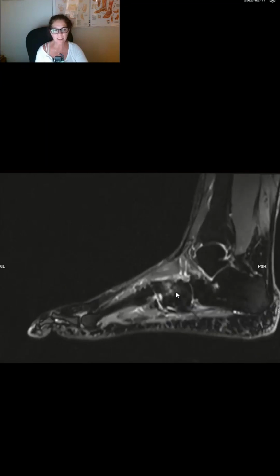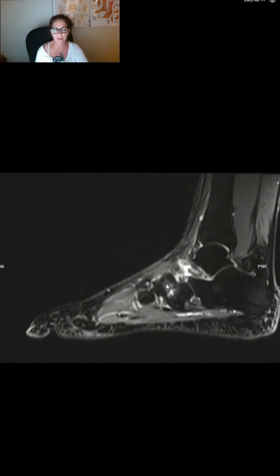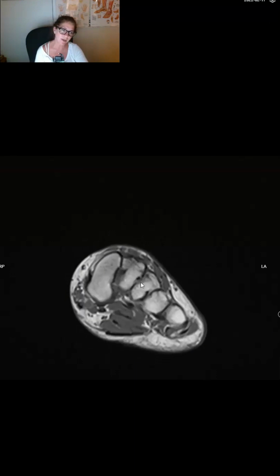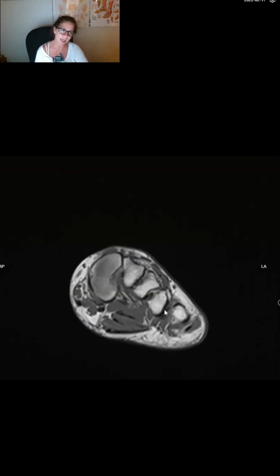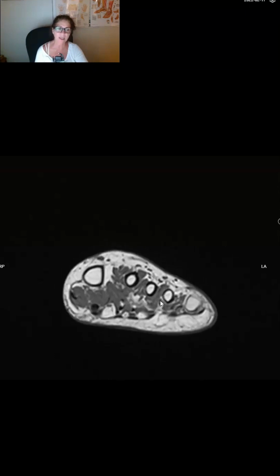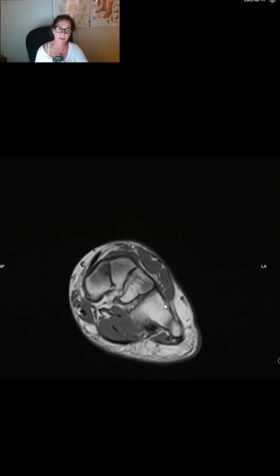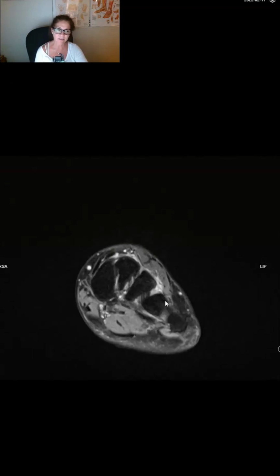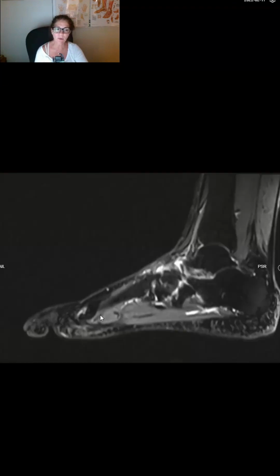So what I'm seeing here is between the cuboid and the lateral cuneiform, there is that stress-related edema. And I would say that looking at the Roman arch of the midfoot, we can appreciate that there is some kind of osteophytes and degenerative change, and there's a subtle gapping in between the base of the fourth and fifth. So as the fifth goes out, which is making a bunionette deformity, we can appreciate that there is some kind of mismatch between the cuboid and the lateral cuneiform, and indeed there are interligament sprains in this region. We talked a little bit about why that might be the case.